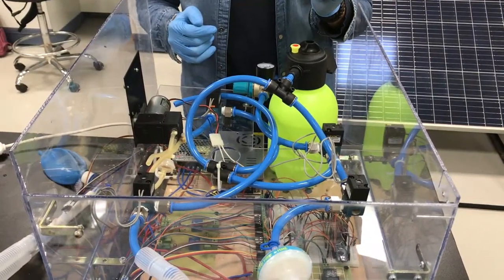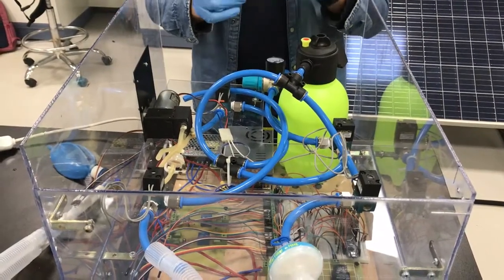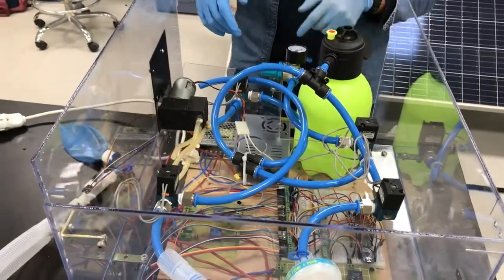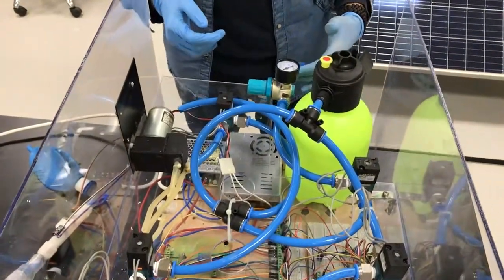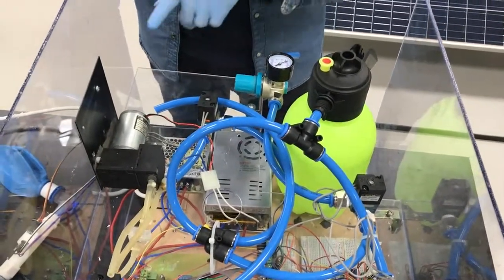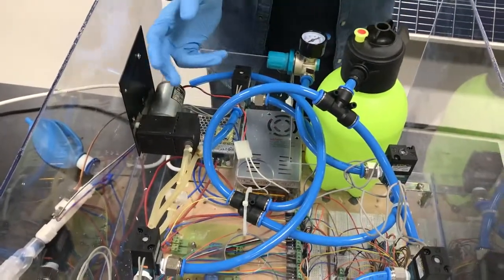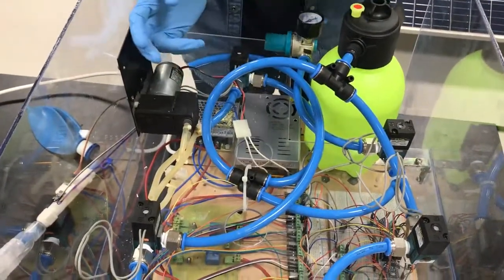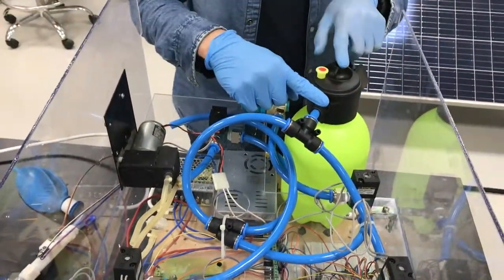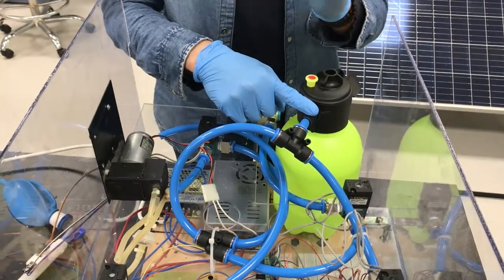In this video, we're going to explain the basic idea of our model and how the flow actually works. Starting from the input here, you can zoom in. You have two inputs, one from the oxygen going to this pressure regulator and another from the air pump here. You have both of them combined in these flows to the tank here to mix both the oxygen and the air to the concentration you want.